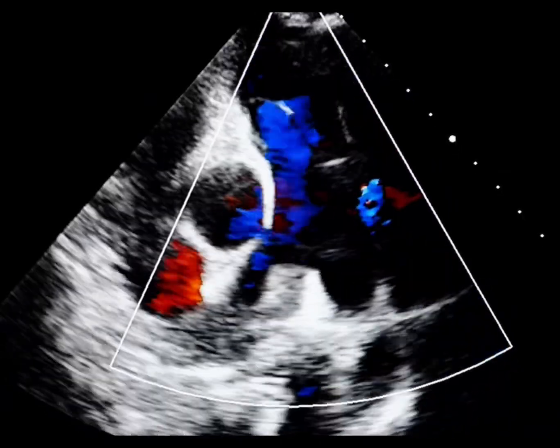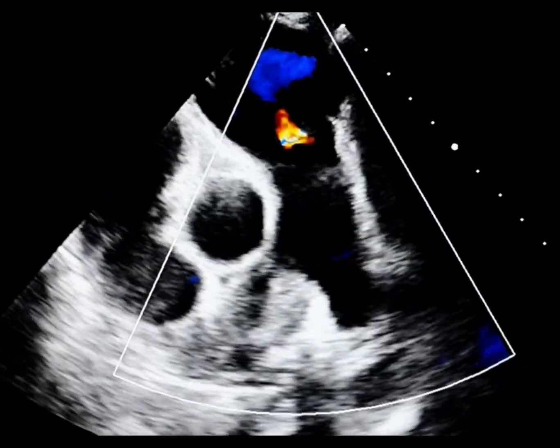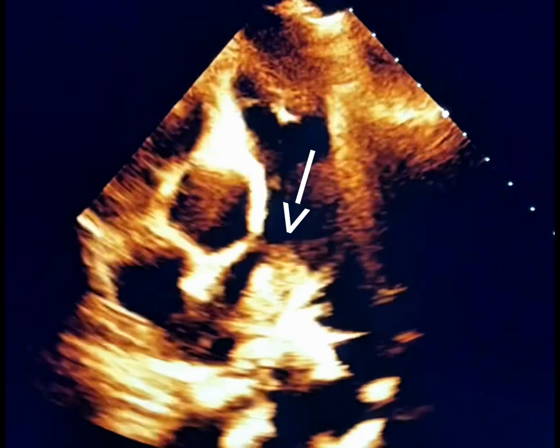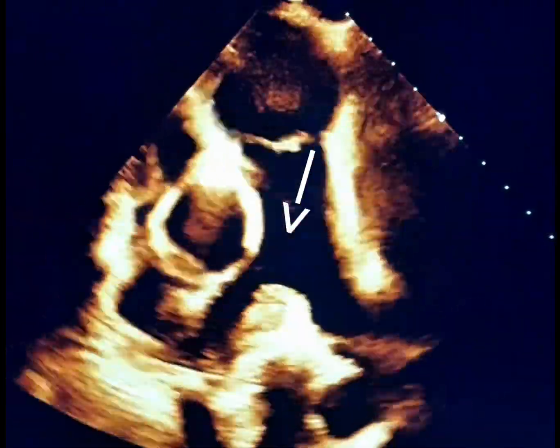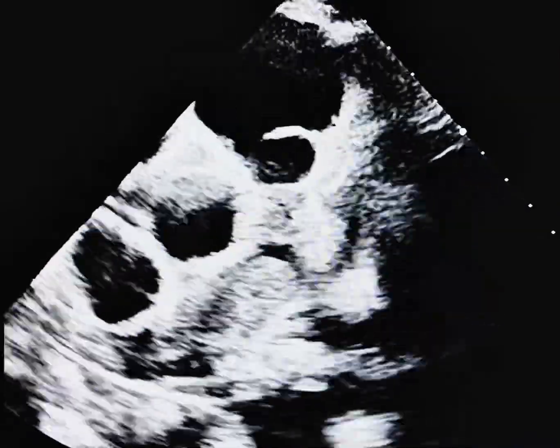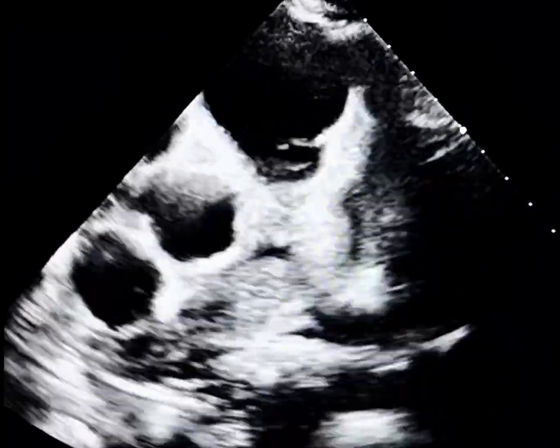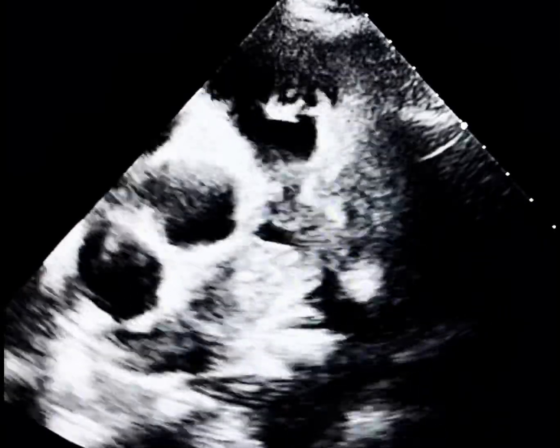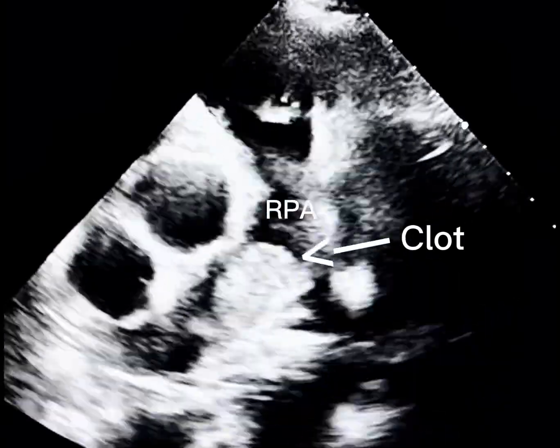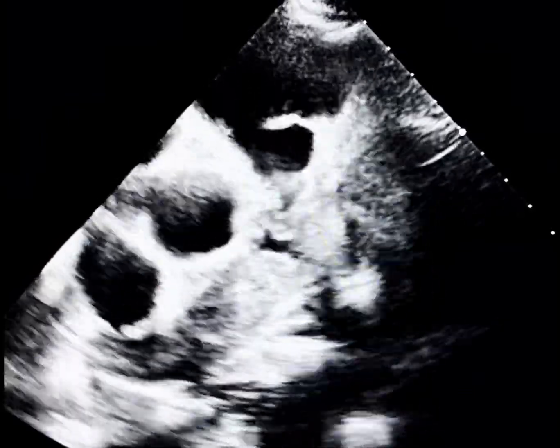While echocardiography is valuable for detecting right heart strain, it has a low sensitivity for detecting clots. The visualization of clots in echocardiography reports varies widely, from about 1.8% to 18%. Therefore, a thorough assessment of the right atrium, right ventricle, and main pulmonary artery and its branches, along with the evaluation of the IVC in patients with right ventricular enlargement and pulmonary hypertension, is highly recommended.